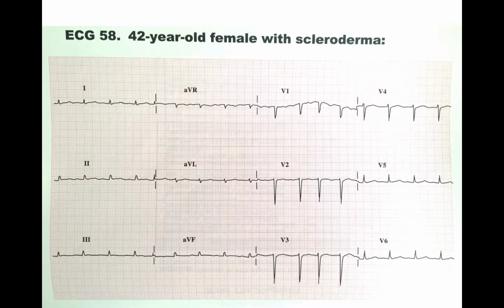this video. Then taking a look at rhythm, looking at QRSs, there's a QRS for every P. Over in here you get some P wave abnormalities, you get some atrial premature complexes in V1 here, as well as V2 and V3 as well. But overall, we have sinus tachycardia.